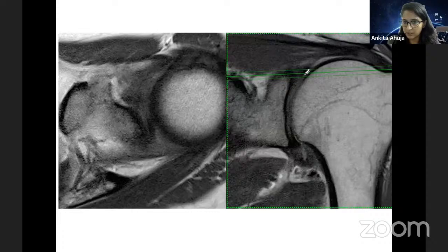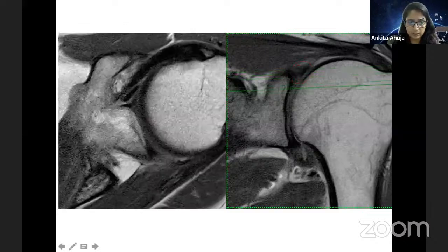My cursor is passing through here. So that means this section is where the superior labrum is, better seen on your coronal images. But let's move down over here. In this section, I cannot see any discrete triangle like I can see over here. Okay, then I move down forward.